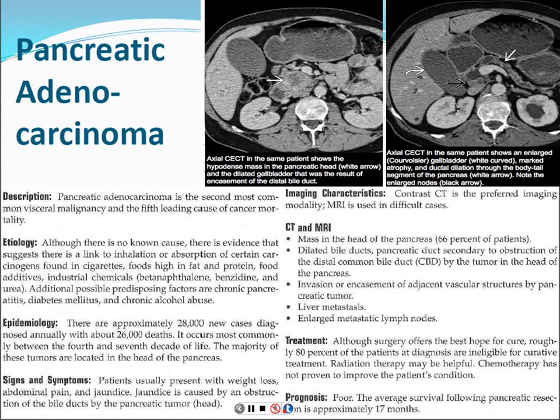It also helps us evaluate the relationship to the vessels and see if the vessels are patent, if they're encased by tumor or anything like that. But some things that you may see, if you're ever doing an MRI study, this is something to look out for. This is the main pancreatic duct, and typically you don't see it quite this well.